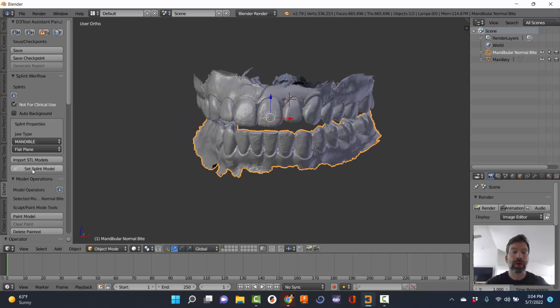Okay, so we need to go ahead and follow the workflow on the left side of the screen. We're going to be working from top to bottom. Anytime you see a little box right here, that means we have to execute that step.